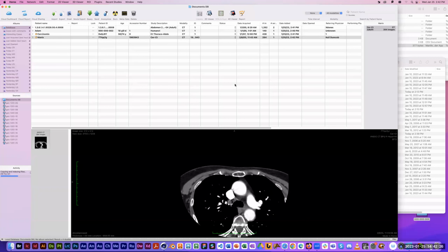That's a little bit bigger data set, so it's taking a little longer. Okay, so everything's copied in.